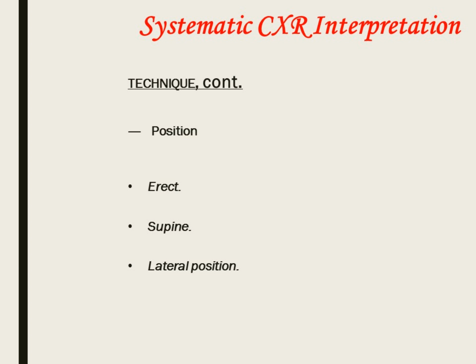So, position. Most of the patients are supine, but it is actually better for looking at the lungs to have somebody sitting up, if possible. You can see the lungs better. If people have pleural effusions, let's say, then you sit them nice and up, and the pleural effusion will layer out and you can see it. If somebody's lying flat, the effusion just diffuses out posteriorly, and then it's hard to say: is this an effusion, is this an infiltrate, it's obscuring some stuff. So if possible, having people as upright as possible can be very useful for us.